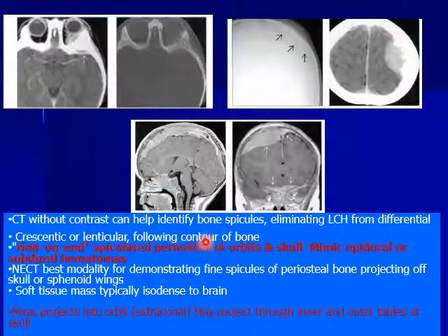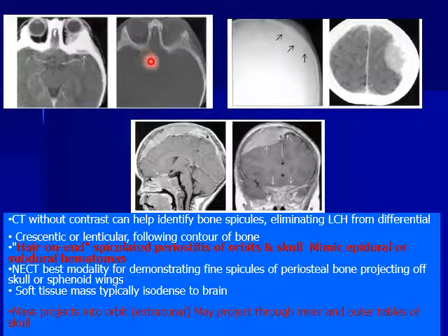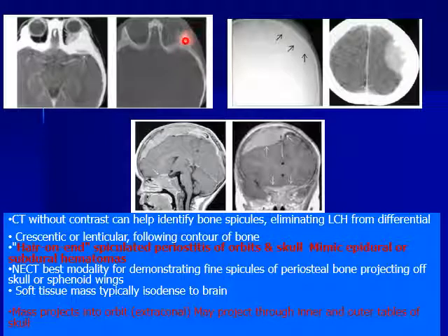Okay, let's see. This is very characteristic. You see enhancing lesions along the orbit, having intracranial, intraorbital component, and a very characteristic appearance in the presence of some type of periosteal reaction similar to that seen in anemia called hair on end. You see spicules upon hair on end periosteal reaction.